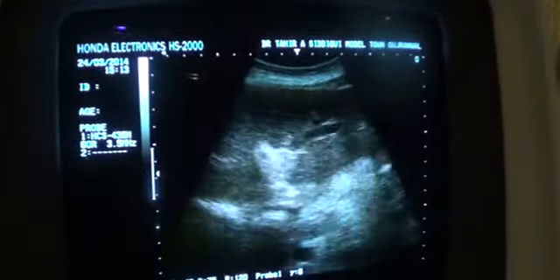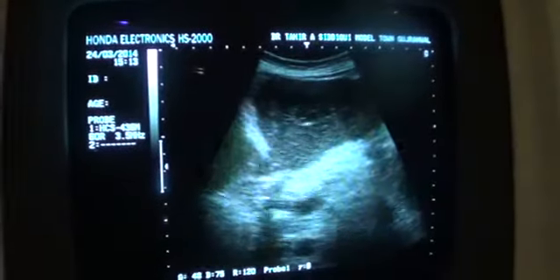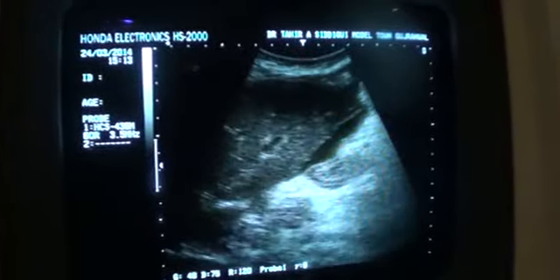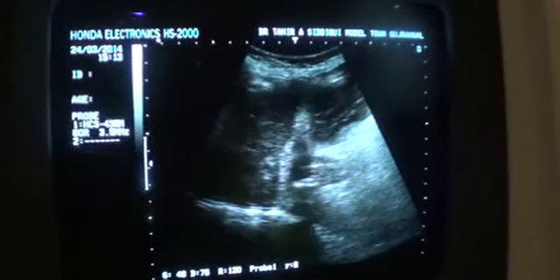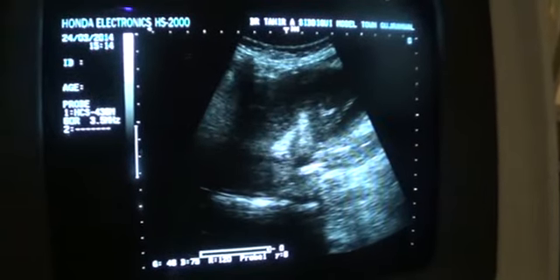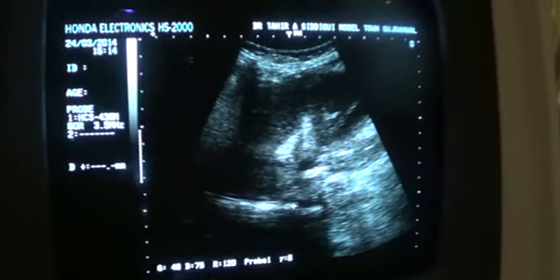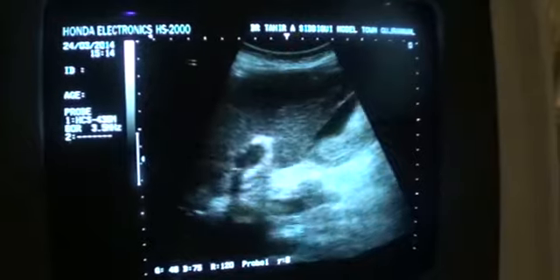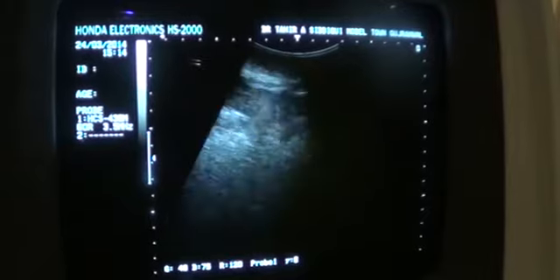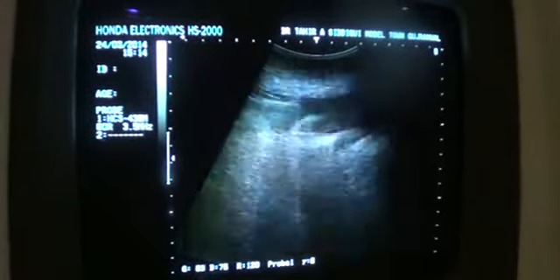So anyway, we see a normal pancreas. We see a patent stent. Again, now see, this is a good picture. See the clear lumen. Internally it's clear. So the stent is clear, the pancreas is normal, but there is ascites, and the ascites is moderate in amount.